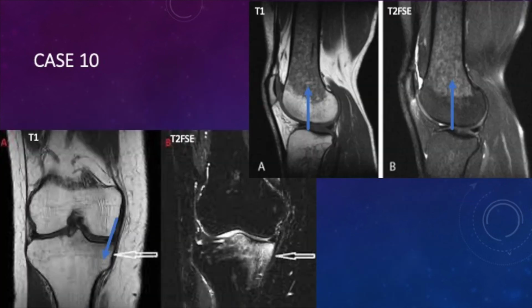So as we can see here on the T1, again, that's what you're looking at, and the fat-saturated T2, well, the T1 is best for determining marrow replacement. So you can see this lesion very intensely in the bottom left on the T2, but on the T1, there's still preservation of marrow fat within there. So it's not a replacing lesion. It has not replaced the marrow. It's preserving the marrow, it's just sort of infiltrating within it. So we have a non-marrow replacing lesion.